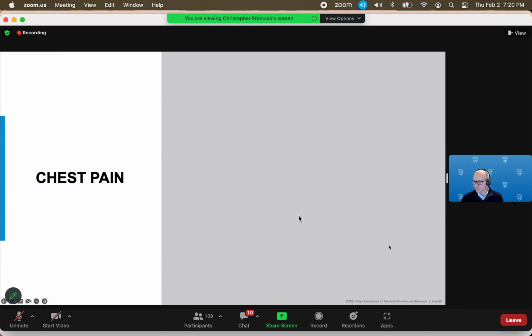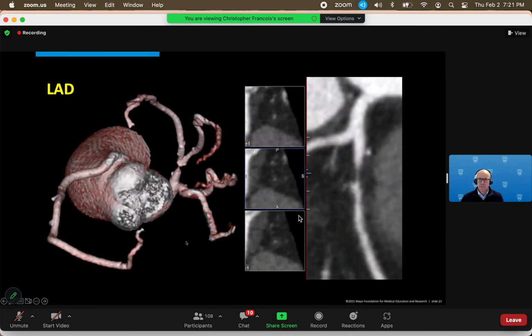Okay, who's next? Looks like some people signed up, so maybe Derek? Yep. Sure. We have another chest pain patient. Okay. This is also the left anterior descending.